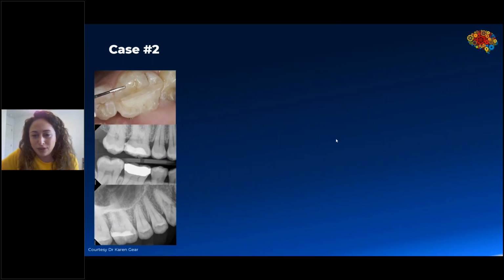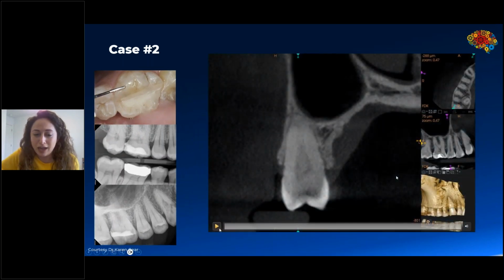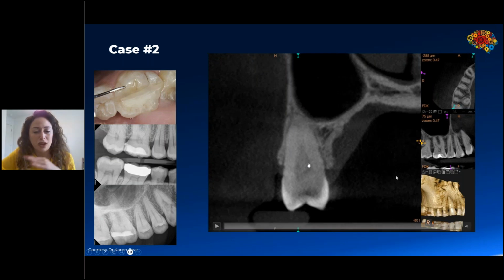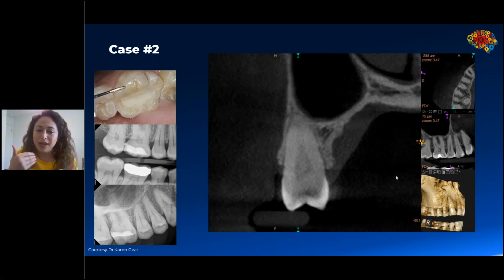So with the scan we're going to look at, I'm already aligned my movement handles, just like we did in case number 1, on this tooth. I have already maximized this coronal view, and we're just going to scroll back and forth at this tooth to search for a fracture line. The rules that we talked about in the previous case do not really apply to this one because this is a virgin tooth. In this case, there's no post, there's no root canal treatment, there's no crown. So radiographic findings might be different around this tooth compared to the other one.